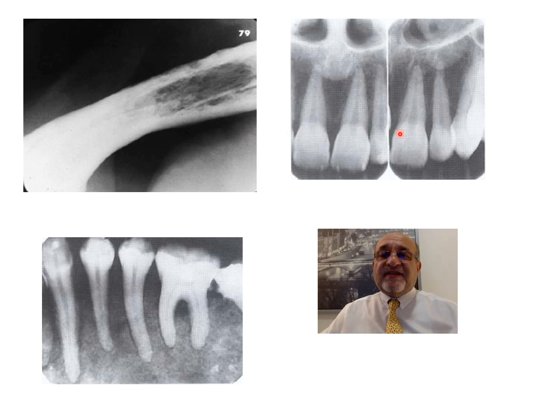Another case, see the central incisors. Typically, if you look at those teeth, they give you the appearance that they have no attachment. They are just placed there. First, loss of lamina dura. No lamina dura is here whatsoever, and the complete destruction of the bone marrow spaces, which gives the typical ground glass appearance.